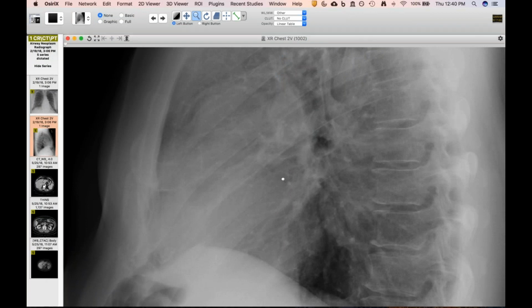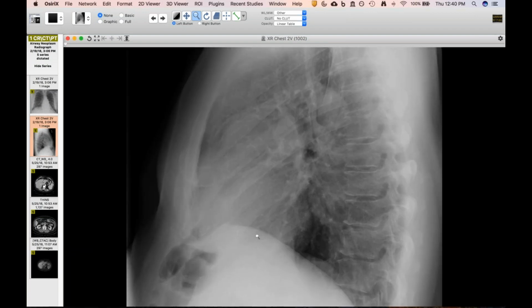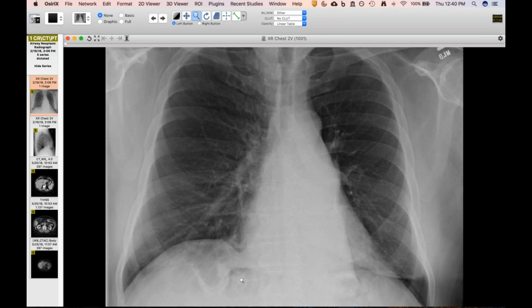Cool. The thing in my experience that trainees don't get, I mean, we emphasize all the findings, but one of those that's most important and often overlooked is the vascular finding. So you ask, where is the left hilum? Where's the left vascular hilum? Of course, it's depressed and rotated medially, number one. And then, of course, the remaining vessels in that lung look odd because they look small and they're separated apart. I call that the diverging vessel sign. And in my experience, the vascular findings are not well analyzed. Yeah. Because it helps a lot to identify the volume loss.